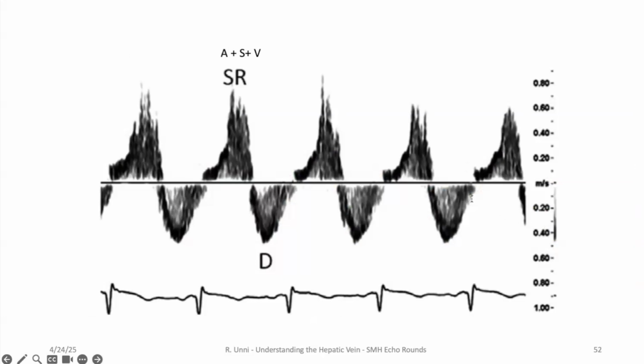I'll just point out, and you may not have thought about this or noticed, that the reversal actually happens quite a bit after systole. If I was going to describe this, I would say it's kind of late. The majority of your reversal is happening late after systole. So we'll compare that to some other cases in a second.